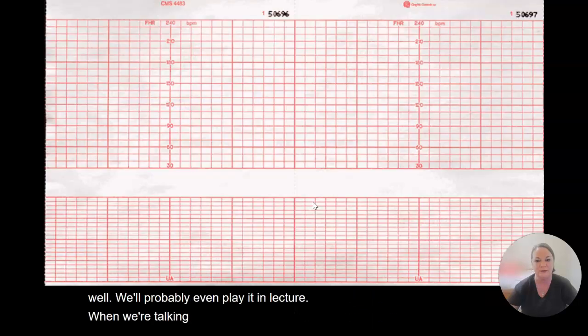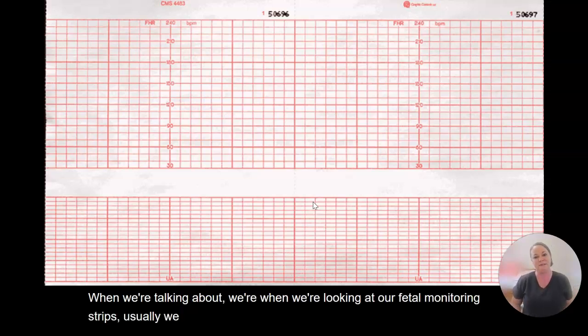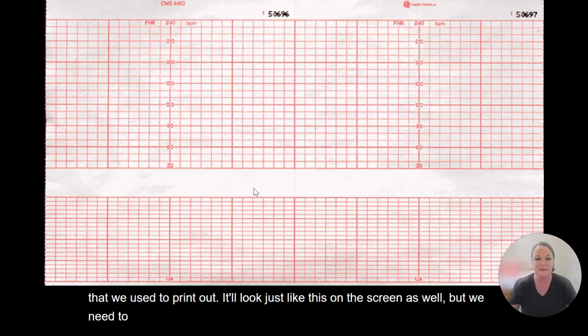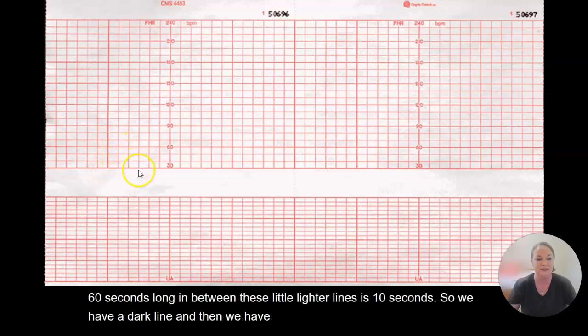When we're looking at our fetal monitoring strips, usually we see them electronic nowadays, but this is an old school paper strip that we used to print out. It'll look just like this on the screen as well. We need to know a few things when we're looking here. Each dark line on this strip is 60 seconds long. In between these lighter lines is 10 seconds. So we have a dark line, and then we have 10, 20, 30, 40, 50, 60 seconds in between each dark line.